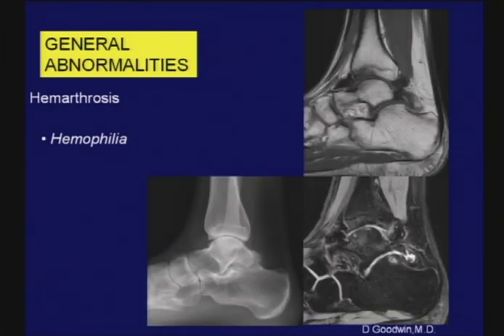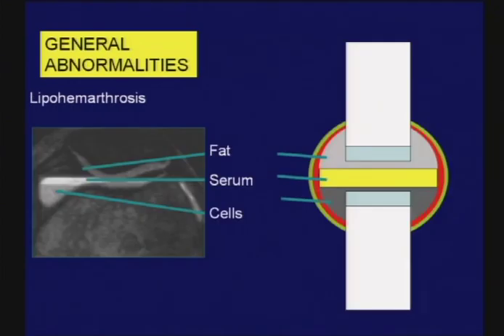And another example of hemophilia, which I like, we can see that the ankle is involved, a common site of involvement in hemophilia, but also involvement of the posterior subtalar joint. For years I have thought if you have a disease that predominates in these two joints in a young adult, hemophilia is a terrific diagnosis to make, because these are weight-bearing joints, and these two will in fact undergo bleeding into the joint.